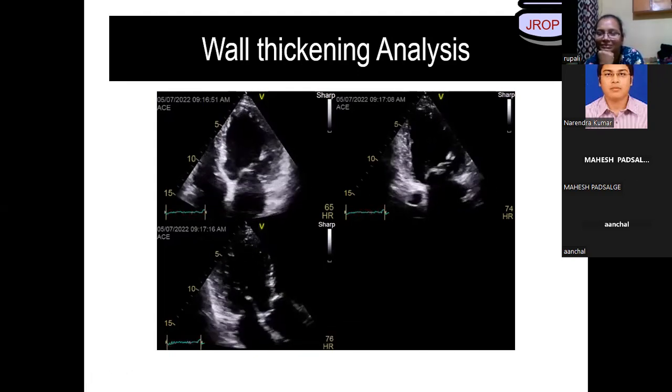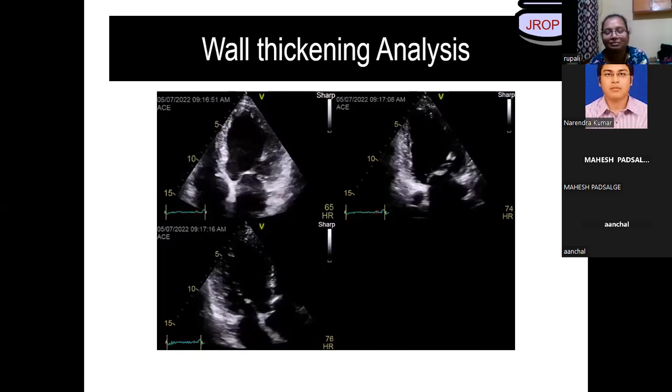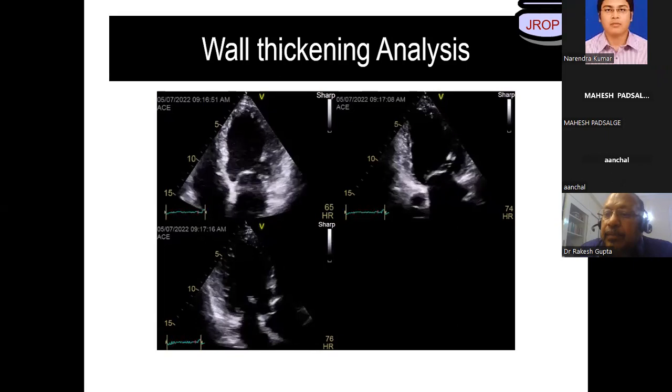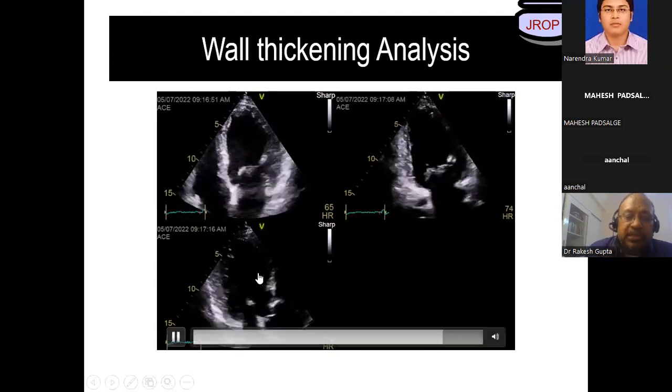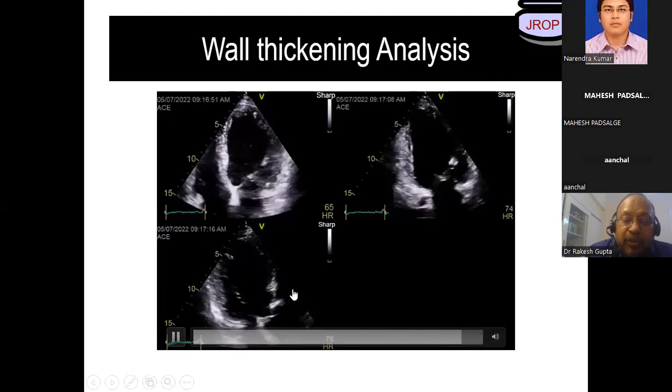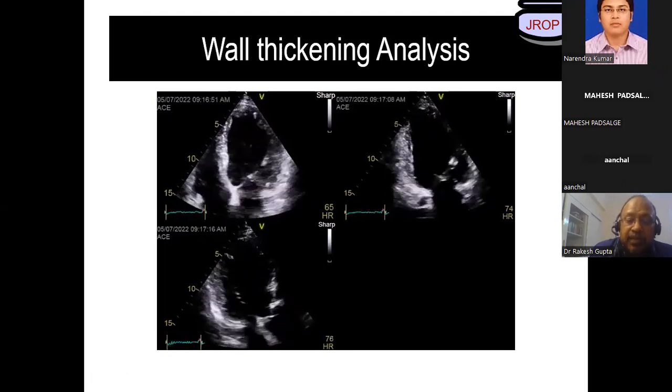All right, let's go to the next person, Dr. Ankit Saini from Panipat. Ankit, are you there? No, he's not there. The next one is Dr. Shashank Tuse. Yes, sir. Shashank, what is this view? Look carefully before you jump and tell me this view is this. Look very carefully. I'm not showing you the correct things all the time.